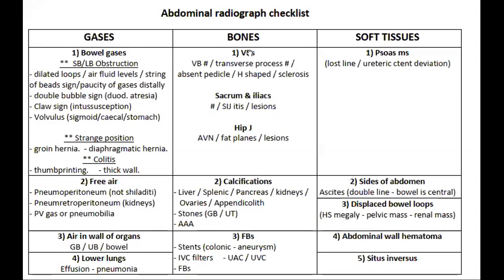This is what is called the abdominal radiograph checklist. We talk about the soft tissue, and we already talked about the calcifications. Okay, let's shift to another review.